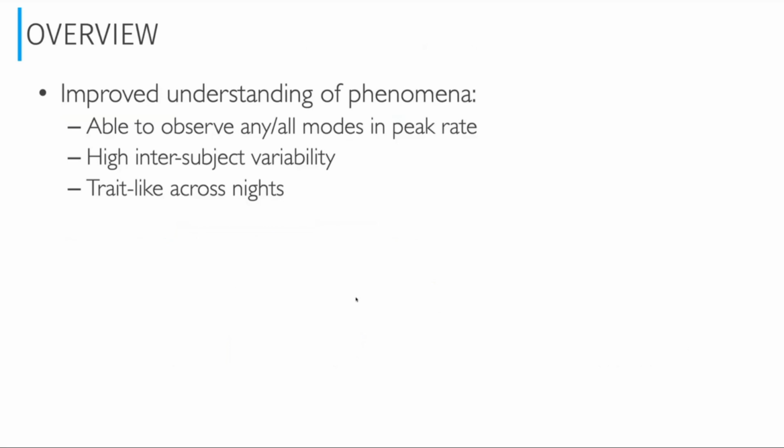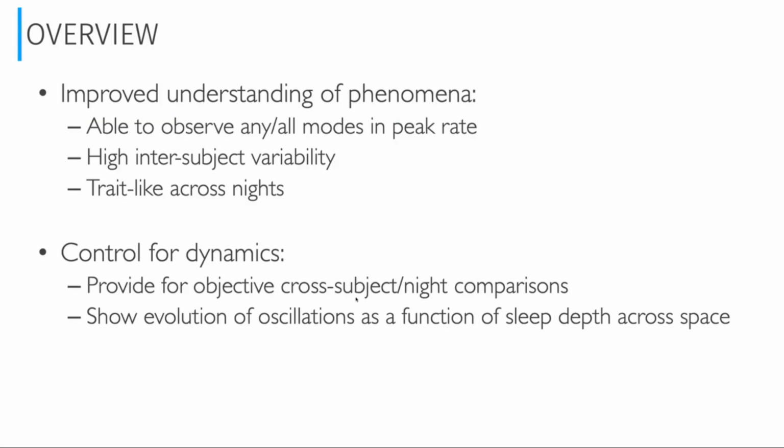And so overall, what this allows us to do is, in a very principled way, understand the phenomena, and observe things that are spindle-like at all frequencies and times of night in a continuous way. These are really robust night to night and month to month, and in some cases year to year, but the variability of that might tell us something clinically. So this allows us to look on a continuous scale of sleep and compare across subjects.